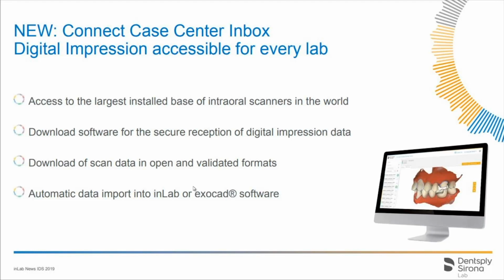It's really cool because if you have, let's say, 10 cases that came in and you want them all automatically downloaded into inLab software, you can do that. Or if you have exocad, you can just say, download all these cases into exocad, and if you import it into inLab or exocad, you will get the margin with it as well.